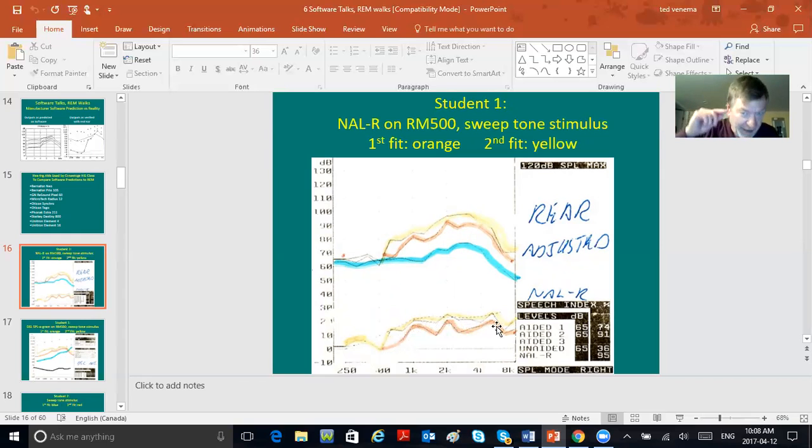We had to increase what the hearing aid was doing so that you got this yellow REAR. And then, and only then, REAR minus REUR, the blue, gave you an REIG that was at target. Do you see? The manufacturer software tended to deliver less.